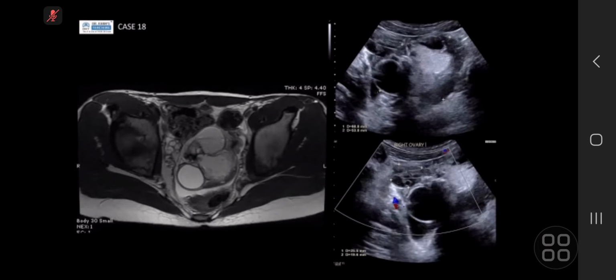I would like to do fat suppression imaging to further characterize the lesion. Yeah, so this is one of the things that you would probably come across in your exam, because it did come up for me in my 2B exams. The reason why I've shown this is that on the MRI, you can see there are also areas of blooming artifact. On T2, you are thinking, is this blood products or is this calcification?